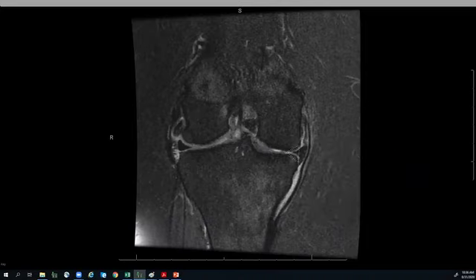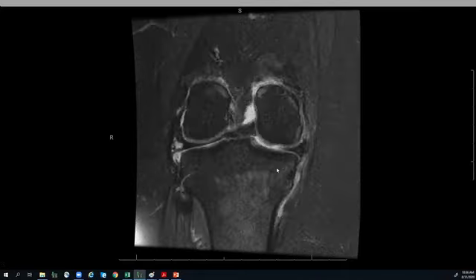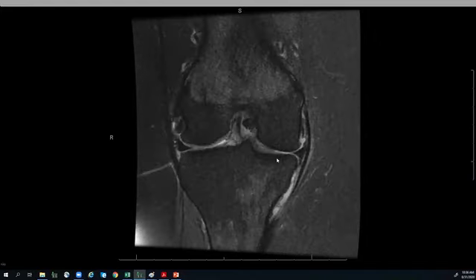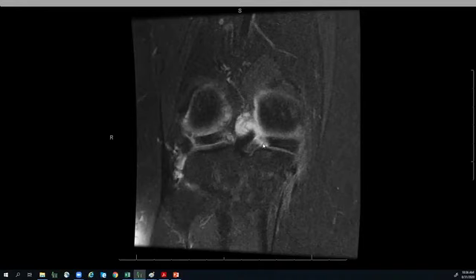But you can tell that the medial meniscus has migrated. I'll draw an arrow. The medial meniscus has migrated medially by a few millimeters, and by extruding medially, it's left the cartilage with very little shock absorber, and you can see that this patient is basically losing cartilage in the medial compartment. So be aware of this phenomenon of the posterior root tear.